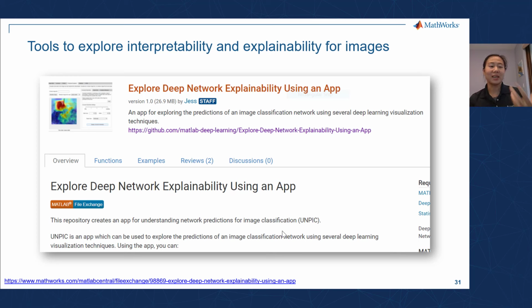And so I like to use it. It's just a really fun way to explore your images and your model and see what exactly your model is focusing on in an image that's leading to a particular result. So especially if you're doing image classification, take a quick look at it, peek under the hood, see how the code works. It's a really, really fun app to use.